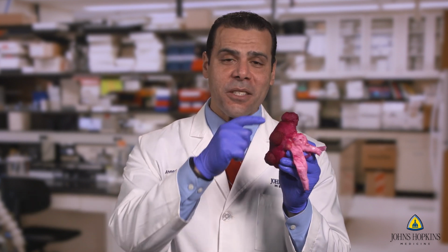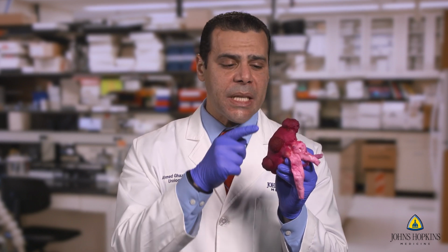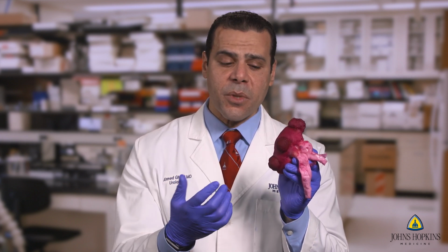This is our robotic partial nephrectomy model. This was designed from an actual patient CT scan. If you look in particular, it's actually from several CT scans because we have 3 tumors. We have an upper, a middle, and a lower pole tumor, each with distinct levels of penetration into the parenchyma, giving the surgeon that's performing a simulation not 1 but 3 experiences.